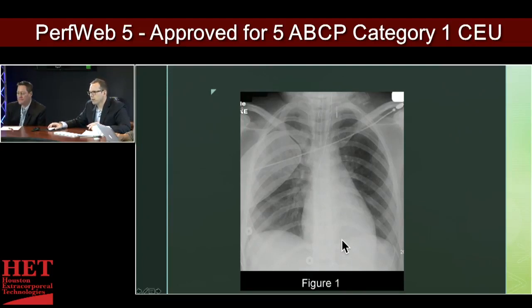So we're moving on to the lines here. We see the endotracheal tube. It stops right here, and you can see the left and right main stem here. So this is just a centimeter or two above the carina, which is where you want the endotracheal tube to be. This, I know just from experience, is going to be a defibrillator pad most likely. And so this is somebody who probably came in a code situation, maybe had a shockable rhythm. They had the pads on them for defibrillation.